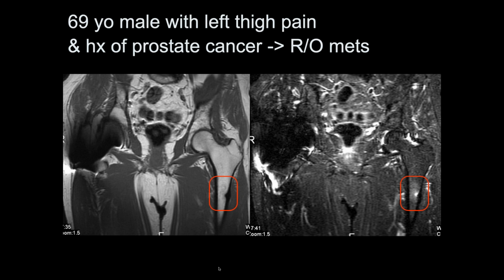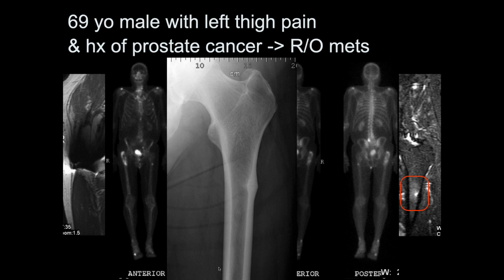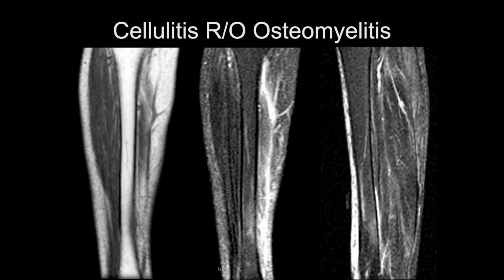I don't remember the details. In this particular case, I have seen other cases where patients will get a hip replacement and they'll get a stress fracture on the other side because they increase. Oh, they're putting too much weight on it. Yeah, I've never seen a case in my repertoire. It looks like he's got a good cortex.